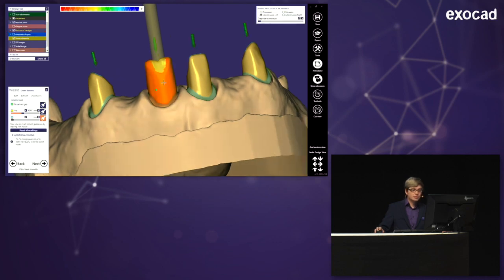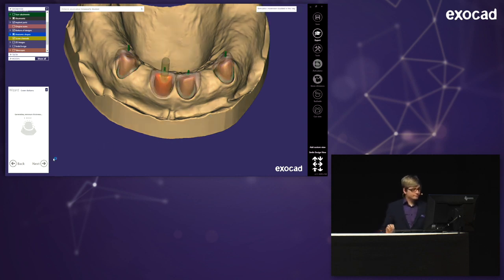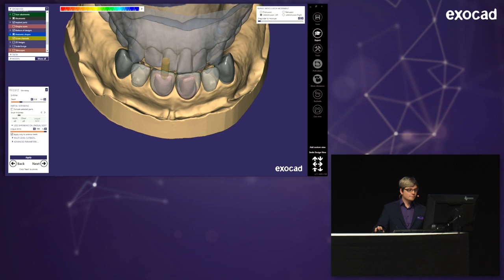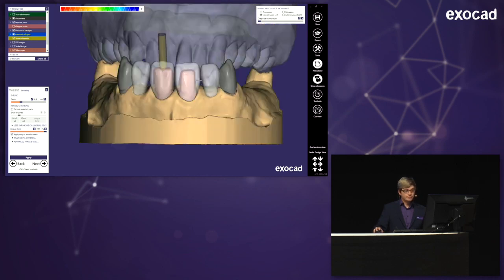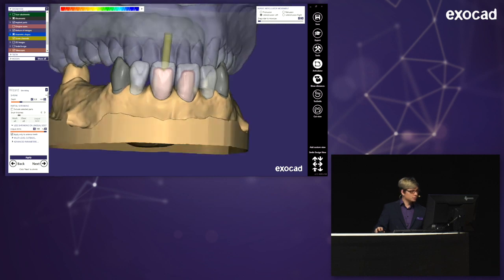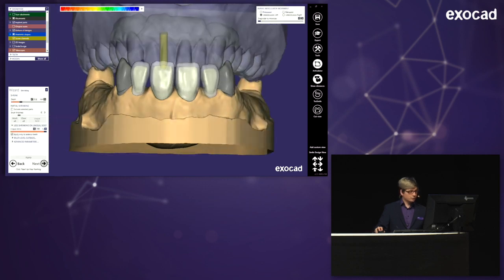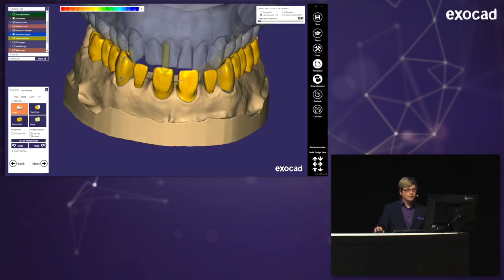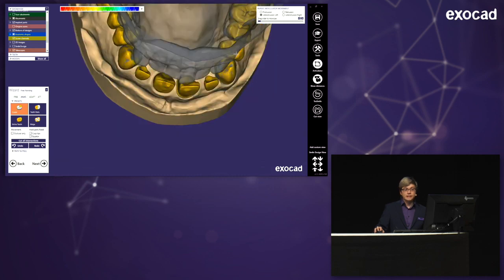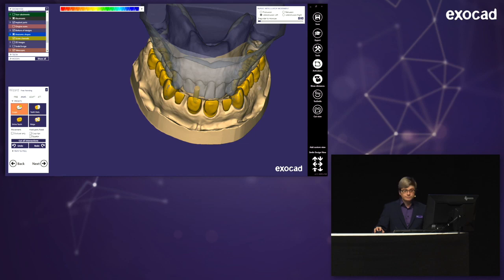And it's generating a crown bottom for the abutment as well. I could change this now, but I'm leaving it as it is. And now I can change my reduced parts, those four here in the front. And I'm reducing them by 0.8 in this case. And going to the next step. And you see now all the anatomical parts. I could actually freeform them right now. There's no reason for me to do that at the moment, but I could.